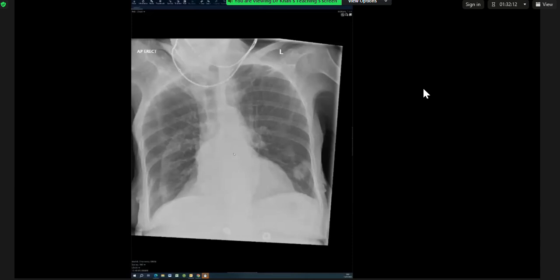We do plain chests, only chests, when it's just a nodule, like the next one. If it was just a nodule, it could have been, in many cases, an overcall. Those are the ones we do CT chests for, when we're trying to confirm there is something there. This one, we want to escalate. So we do the whole staging CT. So that's one thing to remember. If you're suspecting something aggressive, go for a full staging CT just to show that you are concerned for very sinister pathology. Once you've done that, you have to say, I would highlight the report to the referring clinician.